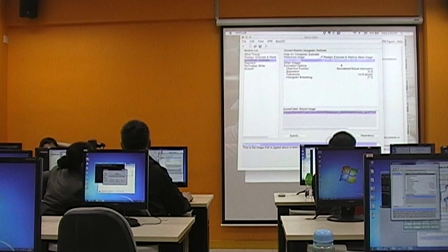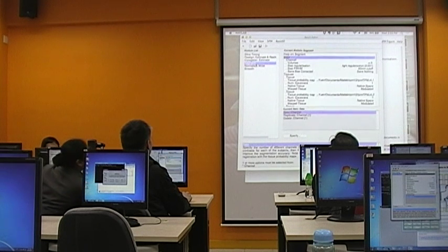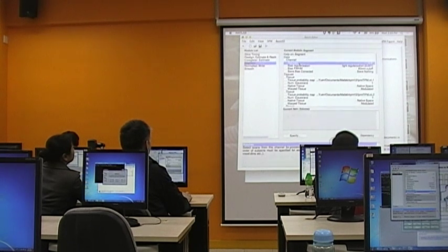So what we are going to do next is to use the high resolution T1 image for segmentation. By doing so, you could obtain the normalization parameters for you to use on the structural and the functional image. Okay. So you just need to put, so here volumes.